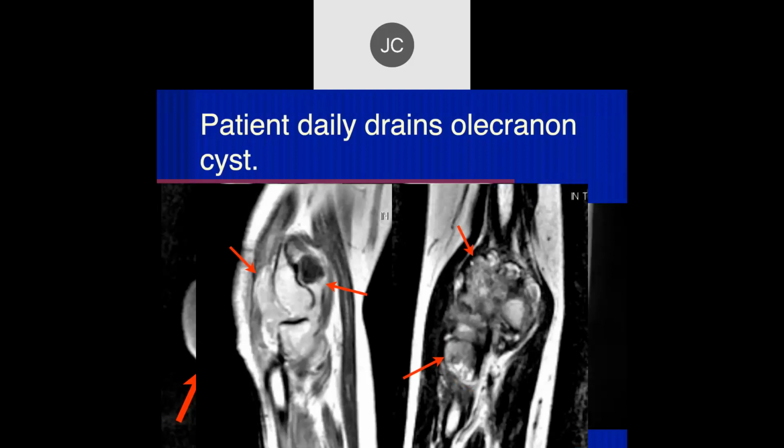Okay, so what's your diagnosis? And if we go here, we can see this is the same elbow, looks similar to the previous elbows. So rheumatoid arthritis. This is, again, a case of rheumatoid arthritis, that the patient just didn't see a doctor and get a diagnosis till it was at this stage.